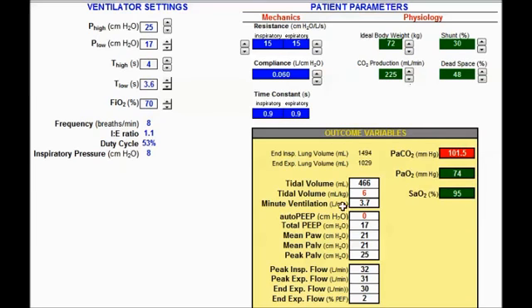And there we go, we have a tidal volume. So as you can see, with this method, when we're evaluating my tidal volume, we're generating no auto PEEP at all by basing my T-low on my expiratory time constant. And then we can easily titrate my P-low setting. So I have lung protective ventilation both with my tidal volume delivered and generating no auto PEEP also.